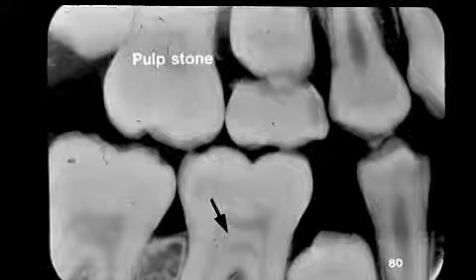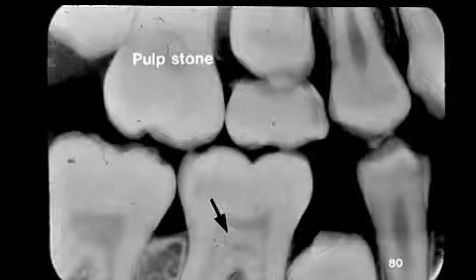The arrow for number 30 points to a pulp stone. Little problem is attached to these pulp stones unless there is going to be endodontic therapy. Above we see tooth letter A. This primary tooth has mesial interproximal caries. Would the dentist place a restoration on tooth letter A for the mesial interproximal caries?